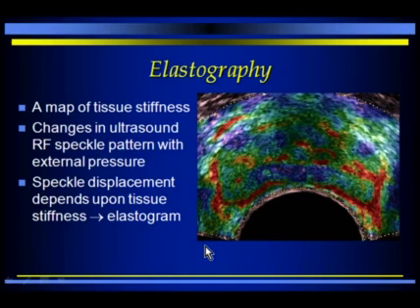As we talk about evaluation of the prostate, it wouldn't be fair to go through this without also talking about some of the more advanced techniques that are being used to evaluate the prostate. One of these techniques is elastography. Another one of them is contrast imaging, and we'll talk about both of these now.